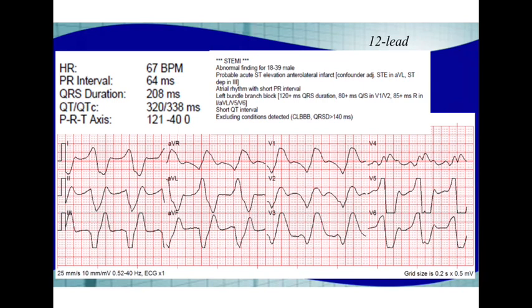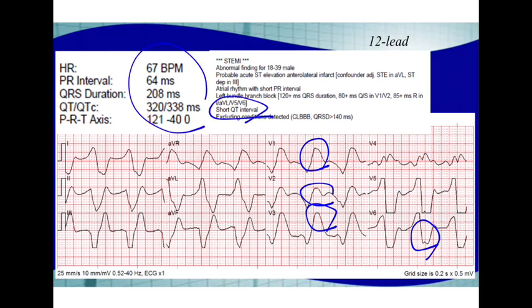The 12-lead monitor itself did not identify hyperkalemia, and it never will. It identified STEMI. It probably was seeing this as ST depression and something like this up here as elevation. Okay, so it was identifying a STEMI. It did identify, of course, the short QT interval, and usually the measurements are accurate.